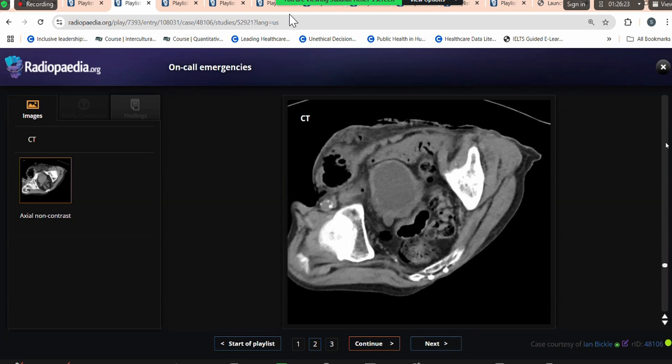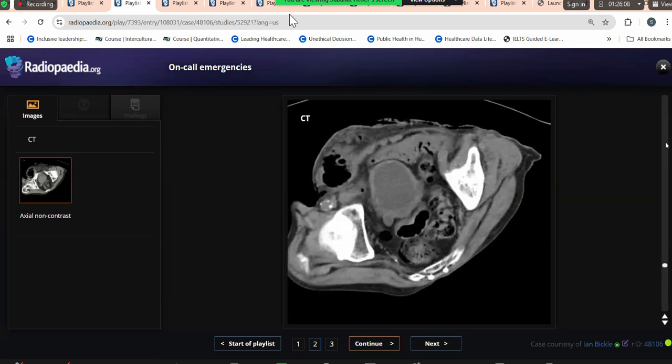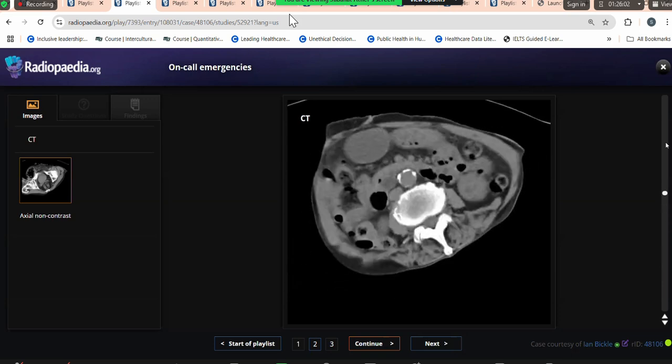In the urinary bladder, there is a hyperdense focus within the dependent part of the bladder. Normally I would do the ultrasound to correlate whether it is movable or not, to differentiate between a hematoma and a neoplastic lesion of the urinary bladder wall. There is associated dilatation of the right proximal ureter as well.